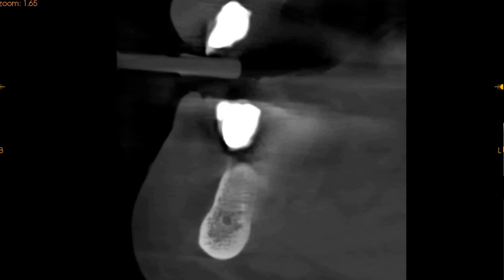The interesting part begins now when we see that these implants are placed. There is bone loss, and the implants are placed just next to the inferior alveolar nerve. This is the mental nerve canal. We can see this is the mental foramen, this orange part, and see that the implants are placed right in contact with it. We don't know if the patient has any paresthesia. We can see half of the implant is out of the bone and there is significant bone loss.